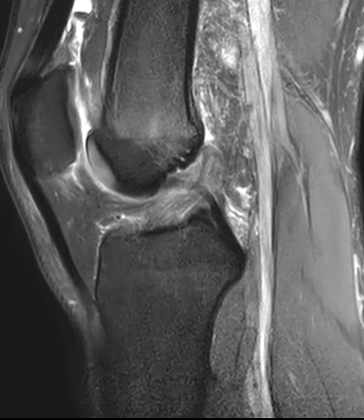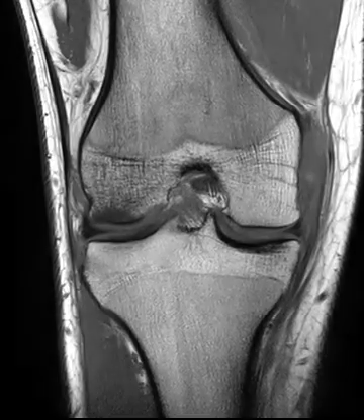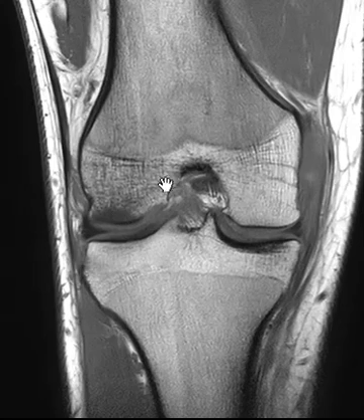Now we're going to go to another patient who has a similar mechanism of injury. Again, this is a common pattern to recognize. Again, here's that lateral impaction injury, medial collateral ligament sprain. Now we're going to go to the next patient.